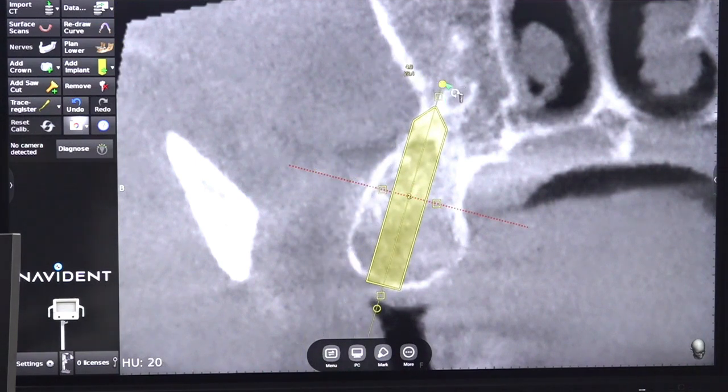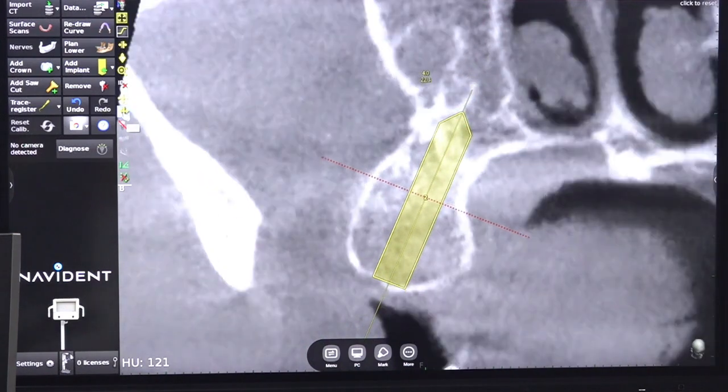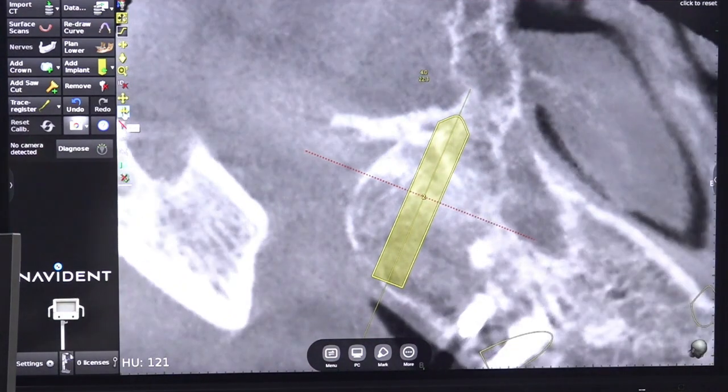So we are planning for a conventional implant, JD implant. So tentative length is around 3.75 into 8 in most of the time. Even we can place a longer implant, even 20 or 22 also we can place. So we will see the 360 degree overview.